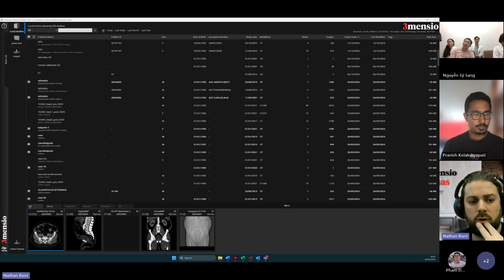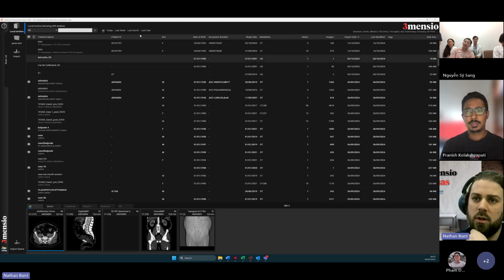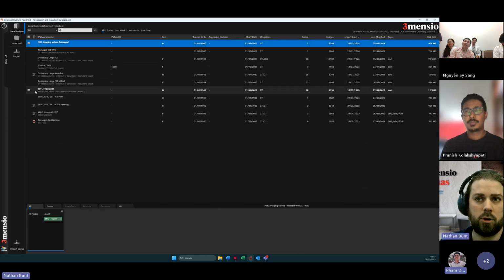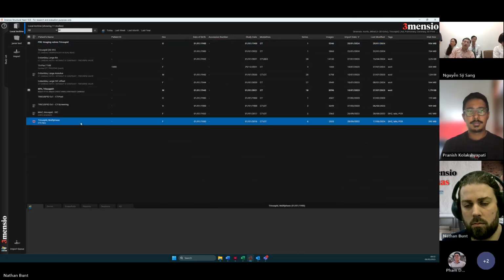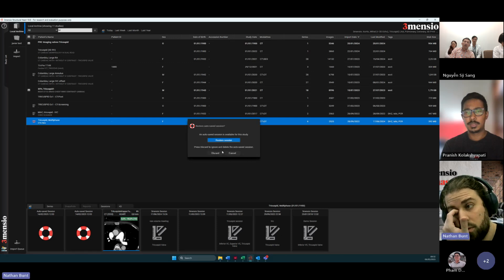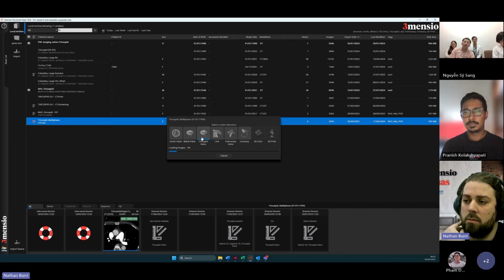So you just finished the mitral part, is that correct? And now we're going to look at the tricuspid. If correct, you're all already aware of the basic functionalities. If I'm doing something that you don't quite understand, please say so and I'll explain. So I'm just going to load a tricuspid study for now.